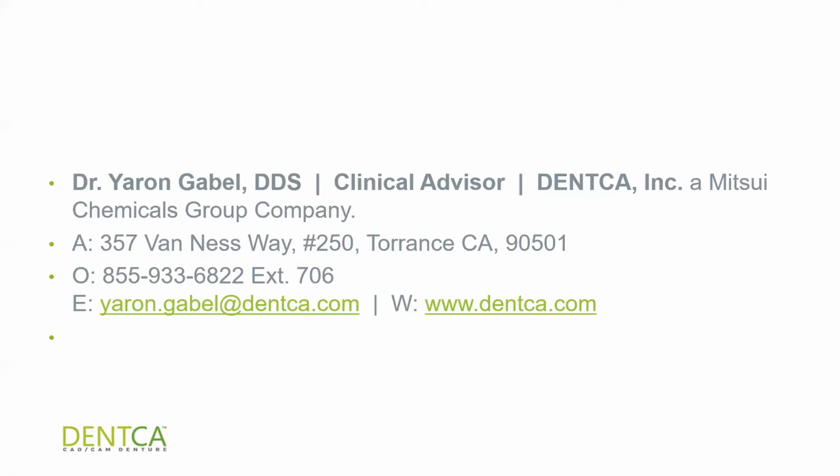So we got a question here that says, does the trim line determine the width of the denture flange?